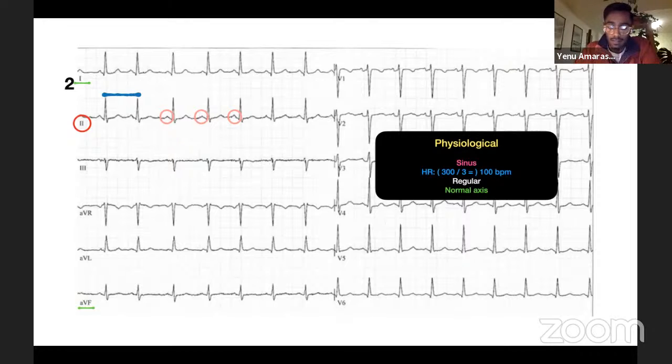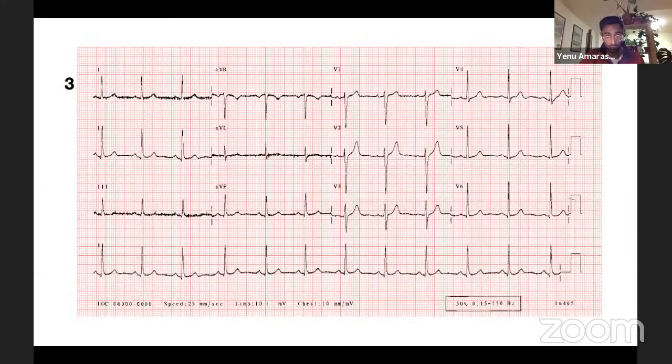And then the next ECG, if you guys take a minute or so to look at this one as well. This is more of a typical ECG that you might encounter in a ward. A nurse may hand you or you may collect it yourself. Generally, we'll have the patient identification at the top of the page. It's been cropped out, and then you'll have the speed at which the paper is running. So it's here.